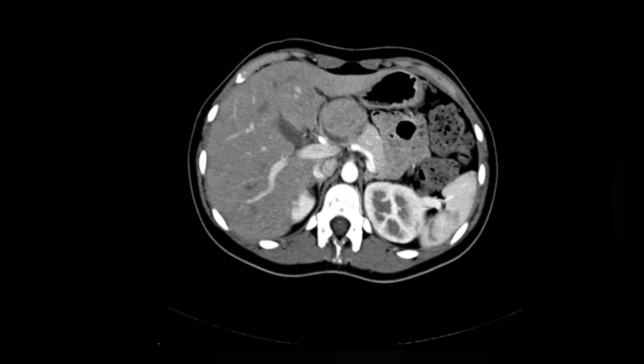Sir, I am provided with a single contrast, arterial phase contrast enhanced axial slices of the CT abdomen at the section of the liver, in which I can see a non-contrast enhancing hypodense area involving the region of the pancreas.